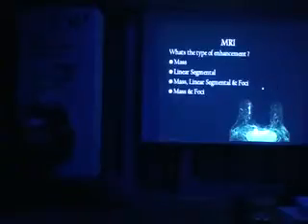And what about this? Look at the left breast. It is normal to find tiny enhancing foci, less than 5 millimeters, especially if the lady came without respect to the menstrual cycle, like you just discussed previously. So this is normal, the tiny foci. In the old BI-RADS lexicon this was called foci of enhancement. Now this has been changed to a background of enhancement, which usually goes with fibroadenosis.